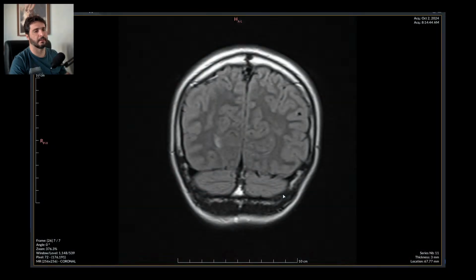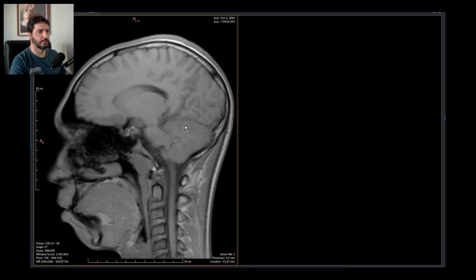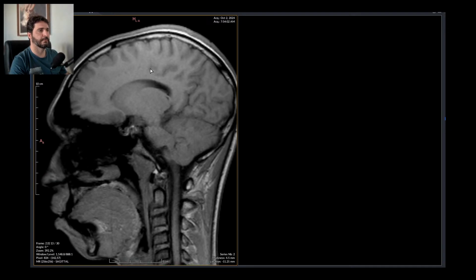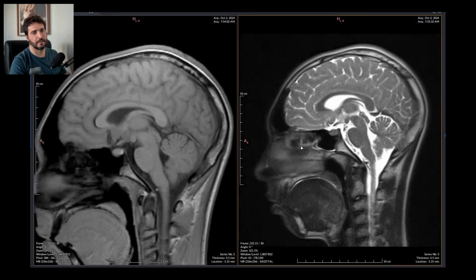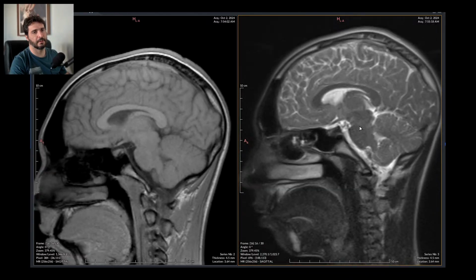So it's downloading. It's a large exam. It's done. Let's load it up. T1. This isn't fun for me. I hope this is fun for you guys, because this is a low field scanner, clearly a low field scanner. Yes, this is very, very bad and usually normal.